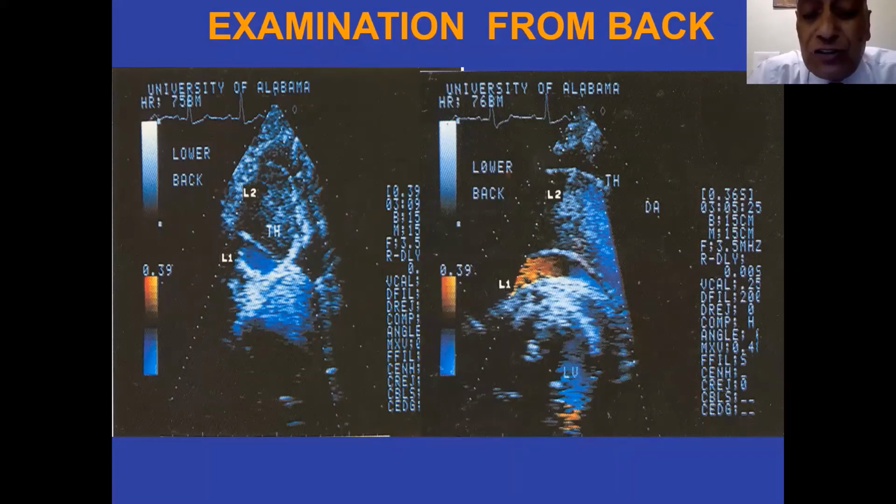If the flow is toward the transducer, that is the reverse flow, red in color, and on the pulse Doppler it is above the baseline, then if it is very short, that is quite normal, or it is seen in very mild AR. In a moderate AR, it might be a little more reversal, occupying a little more of the diastole, but not pan-diastolic. But if you get a pan-diastolic reversal, that generally indicates a severe AR. It indicates more than moderate AR or a severe AR. So this is the type that you get in aortic regurgitation.